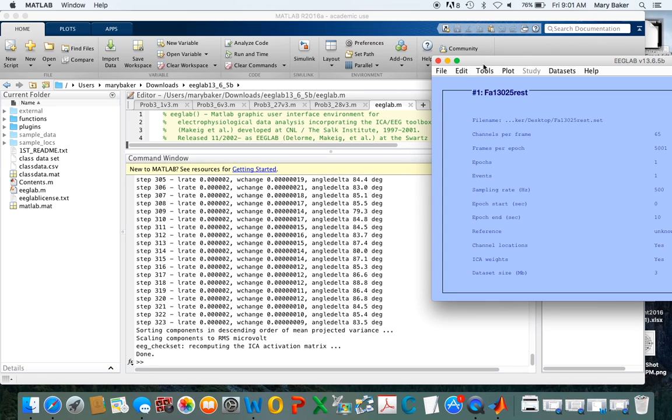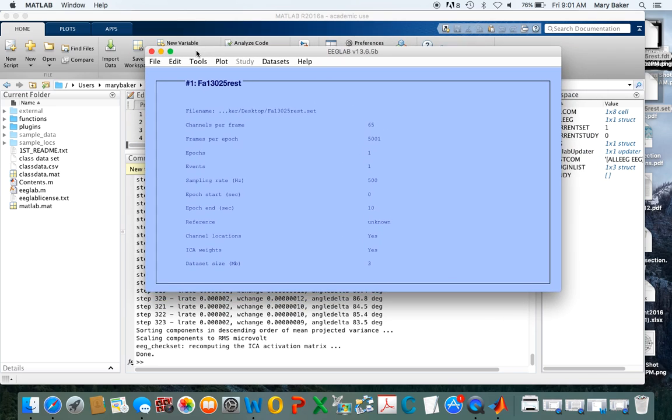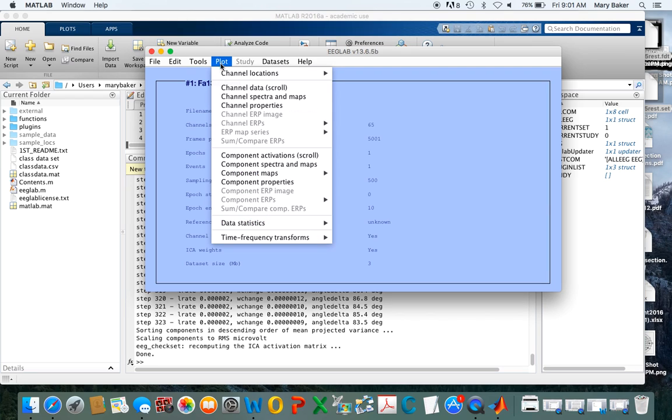So what this means is this algorithm, originally I said there's not a lot of interpretation of amplitude, nor is there interpretation of ordering. These guys within this algorithm that processes EEG data, because they know something about the basic EEG data set, they have gone in and done some of that for you.